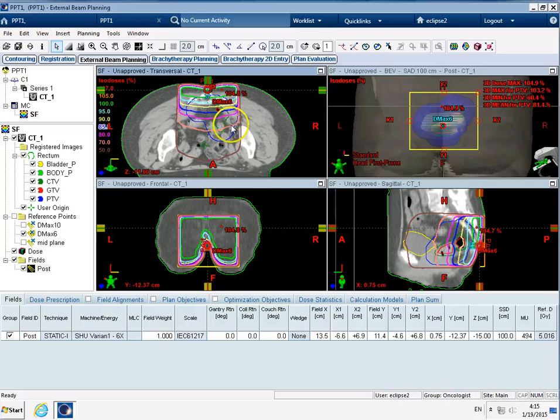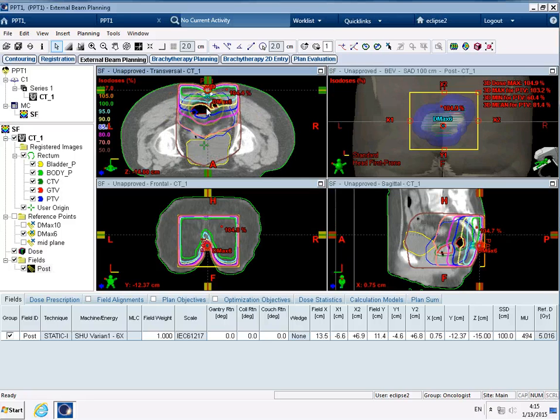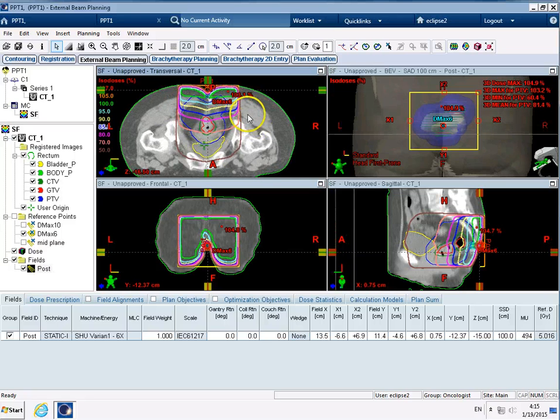Okay, so clearly this isn't very good, is it? So here we're irradiating tissue here that we don't need to, and lower down we're irradiating tissue here that we don't need to. So that equates to that portion there and that portion there. So the thing that we can use to shape the field better is our MLCs, so our multi-leaf collimators, and all modern Linacs have MLCs on them. So that's what we're going to do now.